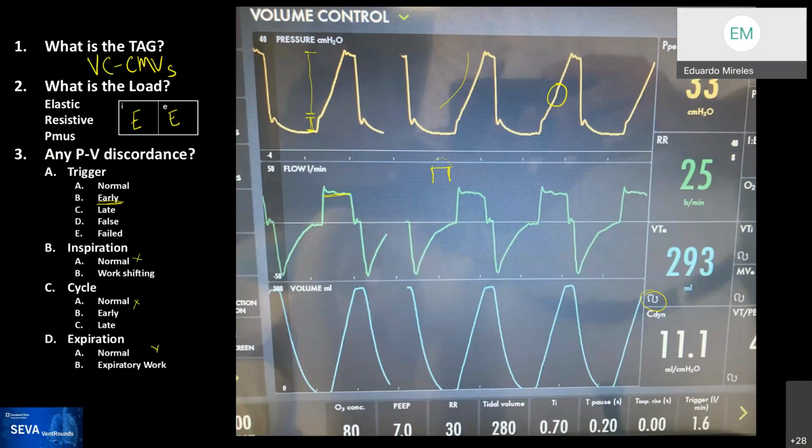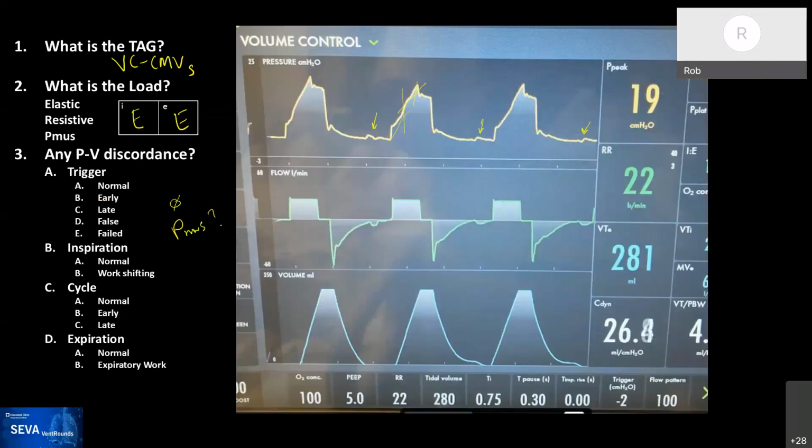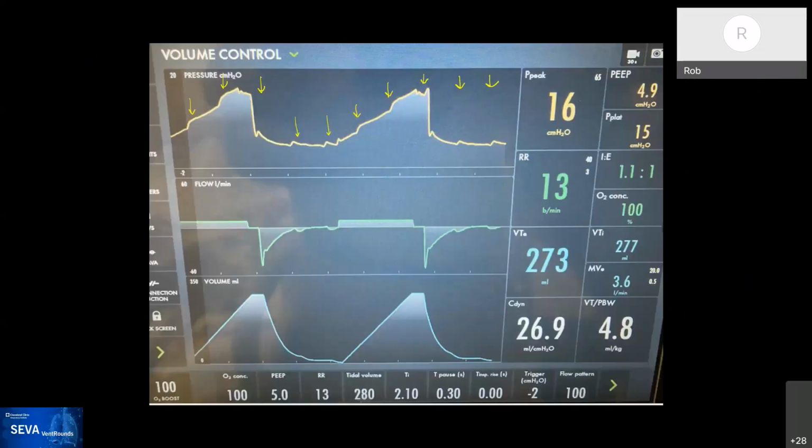Plus the displayed inhaled tidal volume is going to be off. That's right, there's an error. We just wrote a paper on this, which will be published very shortly. Very good. So the point here is, I reactivated the compliance on this patient. This patient had a very interesting physiology, but I thought that the waveforms were interesting.